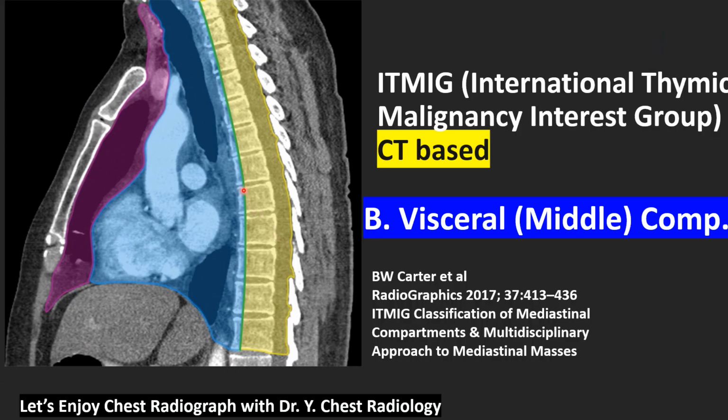Now I think we are already very familiar with this diagram indicating the zone or visceral compartment of mediastinum. This blue-colored zone is the visceral compartment area of mediastinum. Please just forget the term middle mediastinum. We do not use that term anymore. We now use the term visceral compartment of mediastinum.